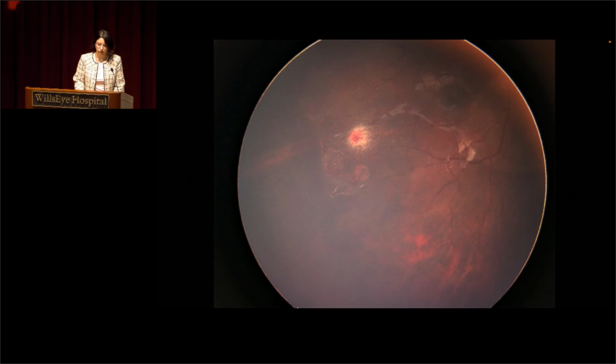Okay. And now we have more of a temporal sweep in the same eye. We can see that lesion we were noticing before, but more prominently, we can see that there's clear pruning of the retinal vasculature, a distinct border of avascularity that we can appreciate here, along with a loop of sclerotic vessel. Maybe some microvascular abnormalities, difficult to say if they're aneurysms, telangiectatic vessels, maybe even some hemorrhage, but clearly abnormal here in the temporal retina. Great.